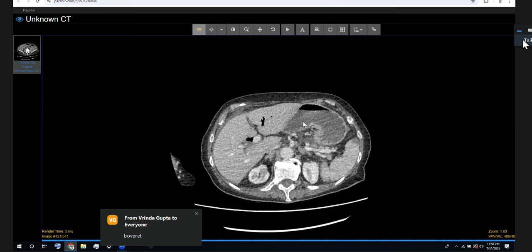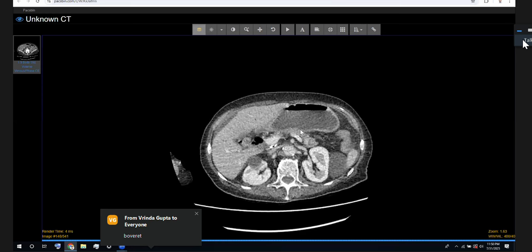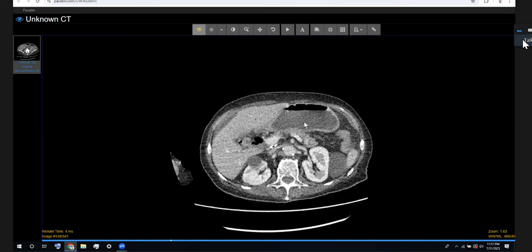So this gallstone has passed from the gallbladder into the small bowel, and then it's worked its way all the way quite distally into the distal small bowel, which is usually how gallstone ileus does occur and present. But sometimes the gallstone will get stuck proximally right in the duodenum. It won't work its way distally, and causes gastric outlet obstruction.